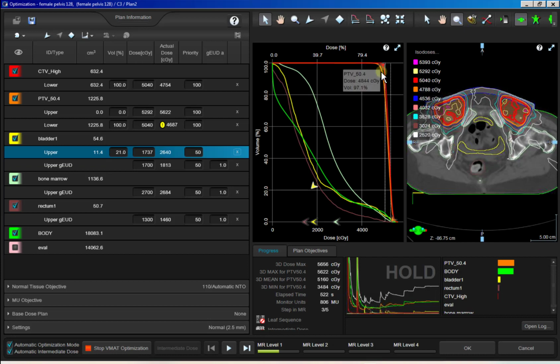Lost a little bit of coverage, but that's the goal in level 1. Level 1, you should be pushing pretty hard. You might lose a tiny bit of coverage. You might have a tiny hotspot. We're going to push play and deal with those 2 issues in level 2.